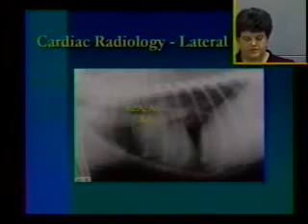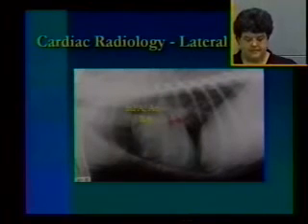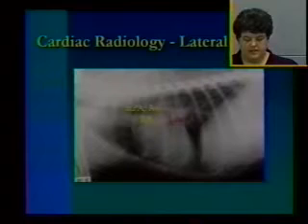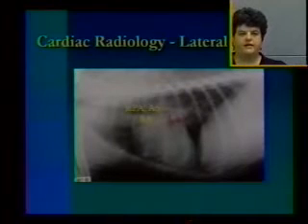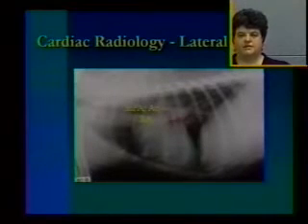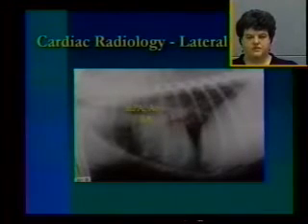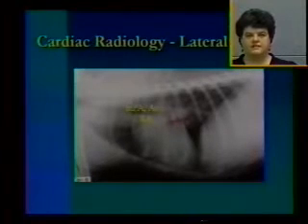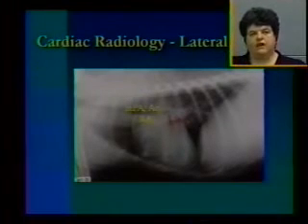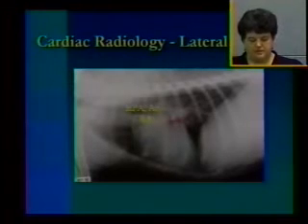Like I said, we'll start with heart. That's where I start. This is the lateral projection of the thorax. And I've just outlined for you the places that the different parts of the heart are located. The left atrium is seen at the dorsal aspect of the cardiac silhouette. You can see it outlined there. When it becomes enlarged, it causes dorsal deviation of the trachea towards the spine. The angle becomes more parallel. If you have enlargement of the left ventricle, just ventral to that, that's a more difficult call, but sometimes you can identify straightening of the cardiac silhouette. Enlargement of the right ventricle is going to cause increased sternal contact, or more of the heart will be in contact with the sternum.